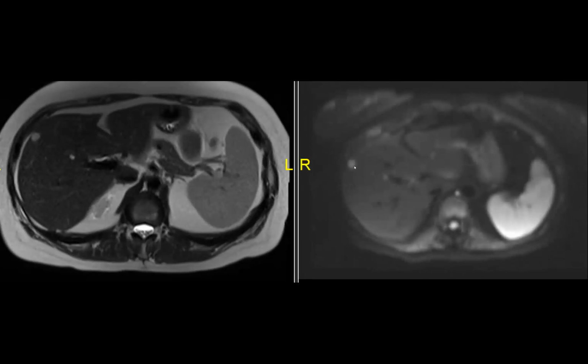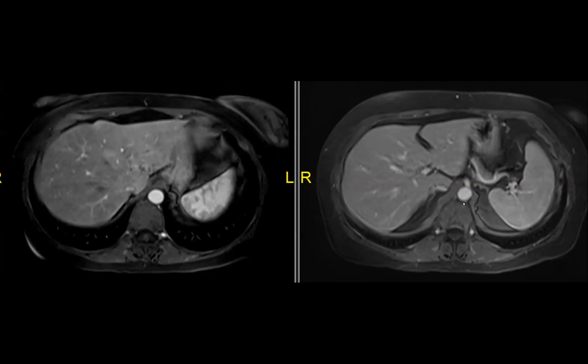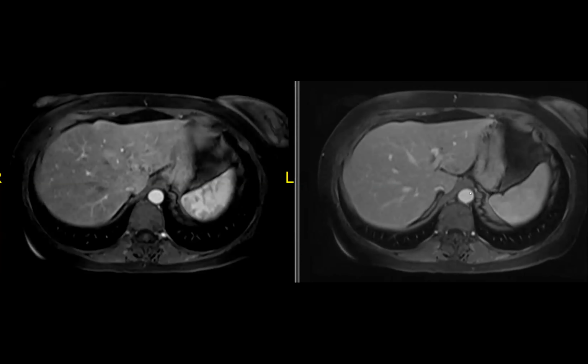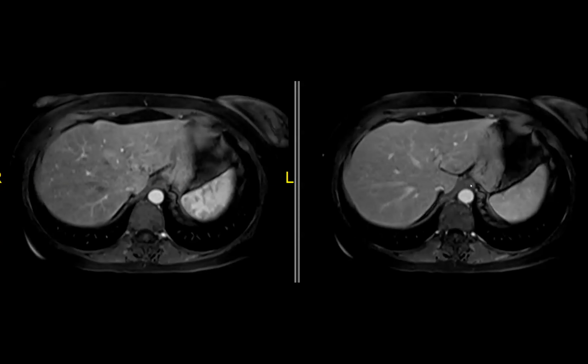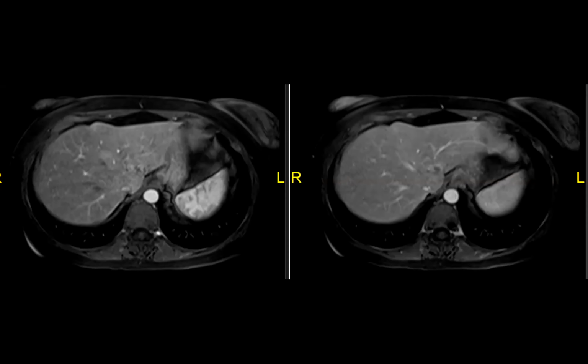Here's the other ones, right? And you can see them. And this is what they look like on post contrast. So the largest one, like this, like so. And then the delayed looks like so. What do you guys think?